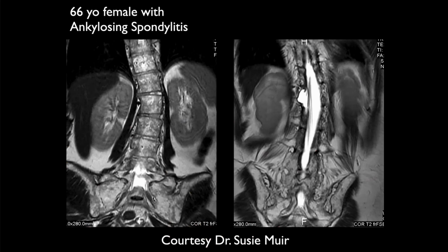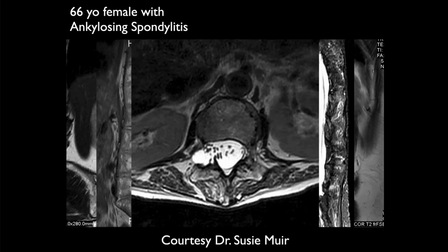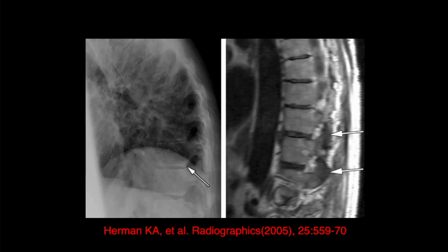Well, let's see. This is not the case. Good. Okay. It sometimes makes me think that it's a different disease from those of males. I don't know why, but it's so darn rare in women. Okay. This is the same. And girls, I never saw a 12 or 13-year-old girl with this disease.